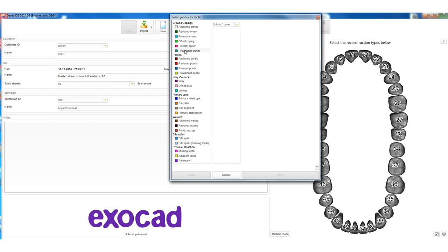The provisional crown corresponds to the classic eggshell temporary. Here we fabricate on an unprepared model before grinding the stumps. We therefore distinguish the bridge links between the anatomical pontic, so same as in the anatomical crown, full anatomy. The reduced pontic corresponds to the anatomical copings, so full anatomy, that is either fully or partially shrunk back for the veneering with ceramics.